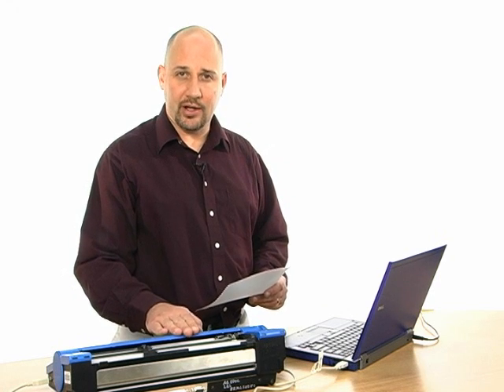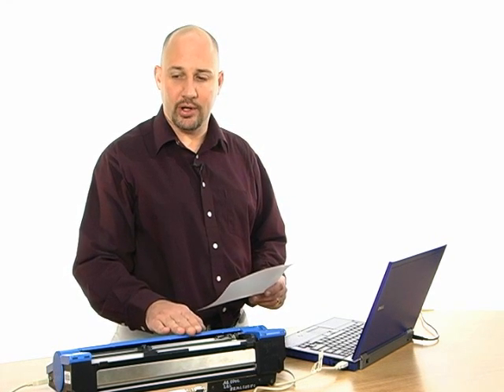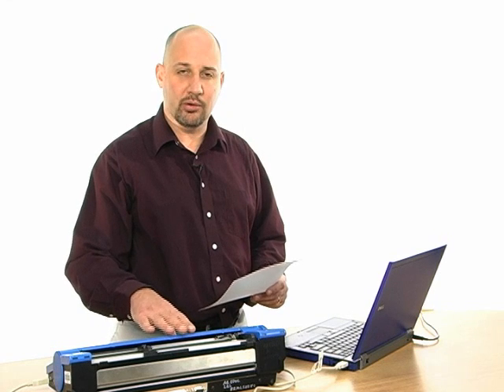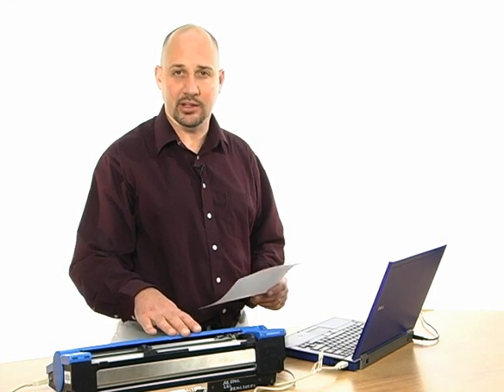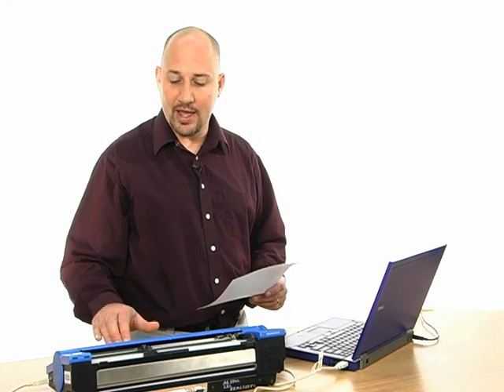If we had a text file that we wanted to translate into Braille, we would need to turn on the forward translation software of the Mountbatten prior to sending the file by issuing the command FE.